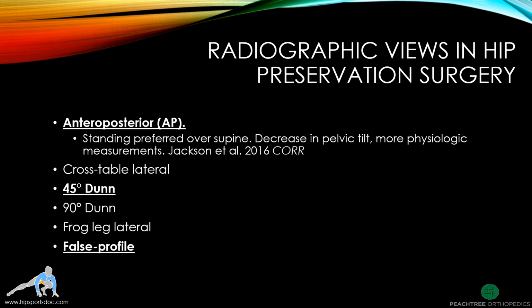Here we demonstrate the primary views taken on plain radiographs in hip preservation surgery. We routinely capture the three underlined views: standing anteroposterior, 45-degree Dunn, and false profile. The standing AP view is preferred over supine as a more physiologic assessment of acetabular morphology.